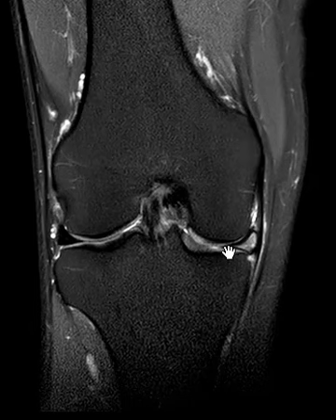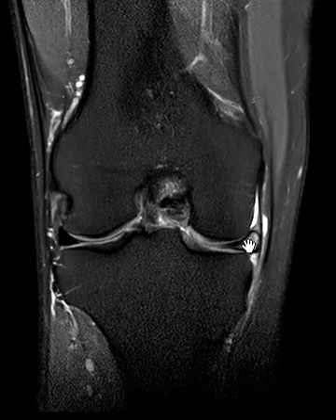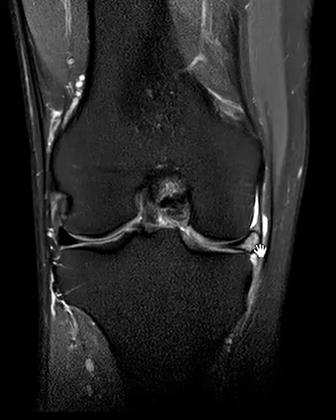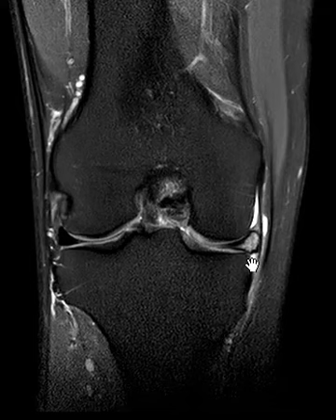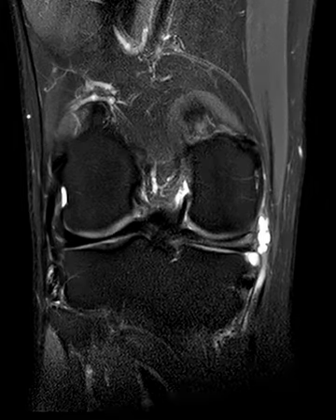So this is the meniscus, but within the meniscus, there's this bright signal. And the meniscus is expanded too. This is a mucinous material that expands the meniscus, and we call this a meniscus cyst. Again, it doesn't touch the top or bottom. It may not be easily visible with a scope, but sometimes these can contact the periphery, and they can lead to these fluid collections outside. We call this a parameniscal cyst.